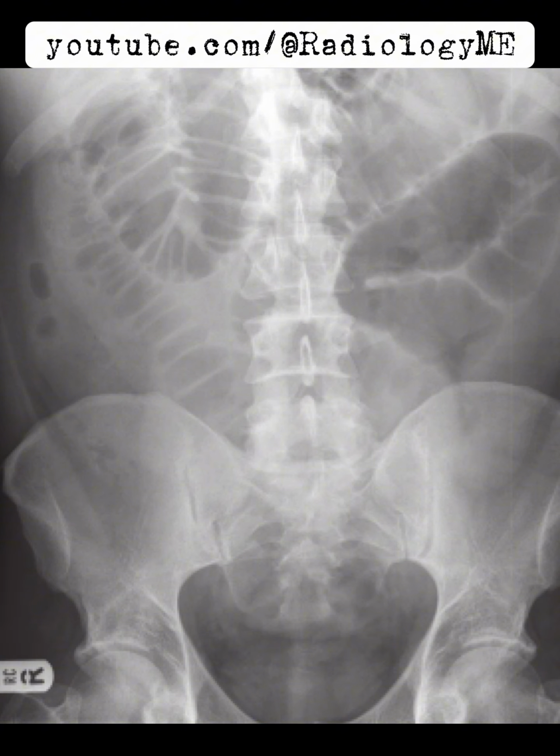In an exam setting, you might be asked about the imaging features of intussusception and how to differentiate it from other causes of small bowel obstruction. Key features to highlight include the target sign on axial images and the pseudokidney sign on longitudinal views. You should also be prepared to discuss the importance of identifying a lead point in adults, as intussusception without a lead point is much rarer in this population compared to children.